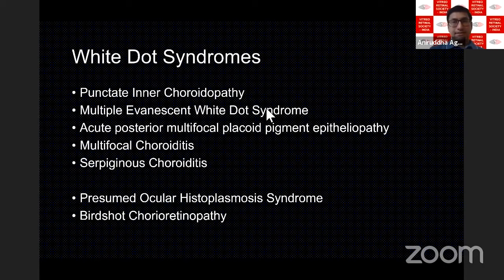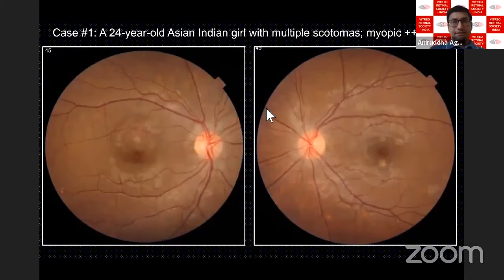So let's directly go on to our first case. I have a series of 5 cases here, and from each case, we'll try to get a learning lesson of how OCTA adds to our knowledge and helps us manage these patients.